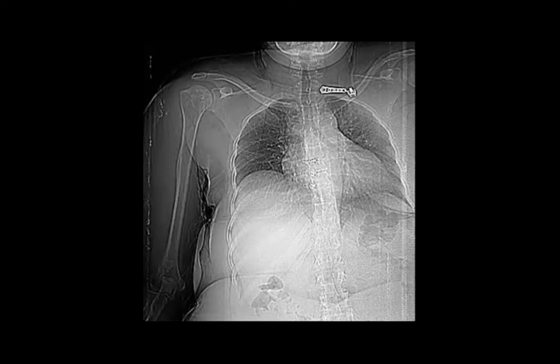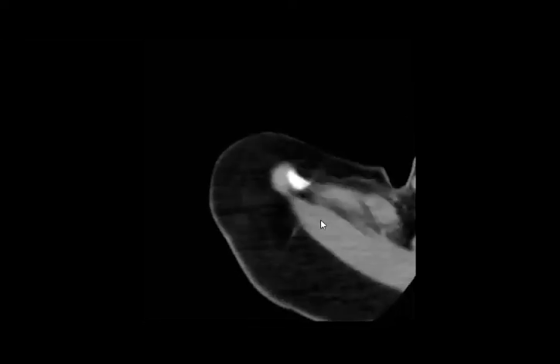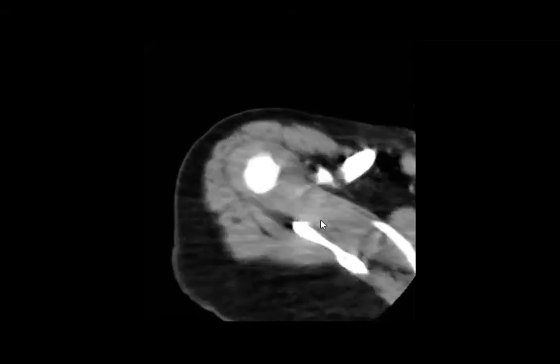Hussein, thank you. You add something. Adenocarcinoma from anywhere can be sclerotic. It can give a sclerotic appearance. Okay, thank you. So I expect that the shoulder, the right humerus, has something. Then when we go to the CT, let's have a look, and you can help me to find any abnormality.